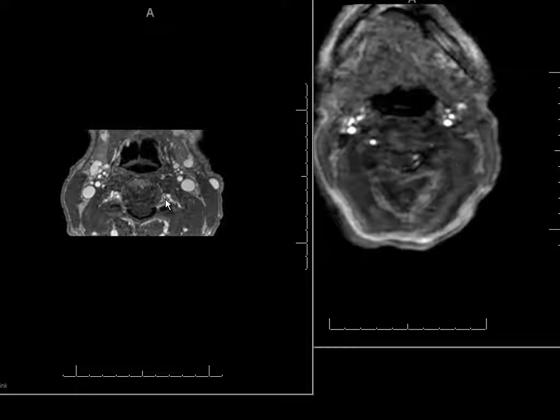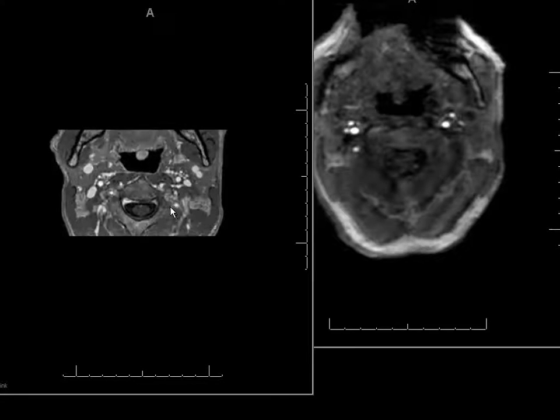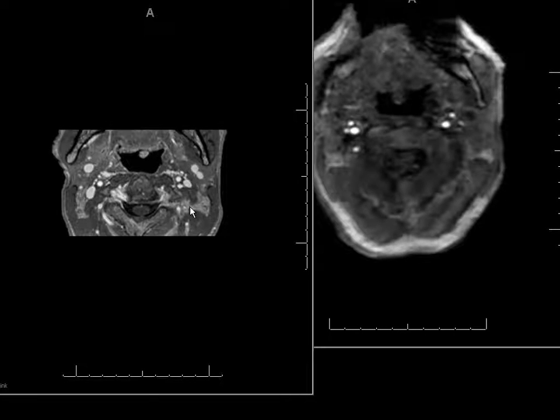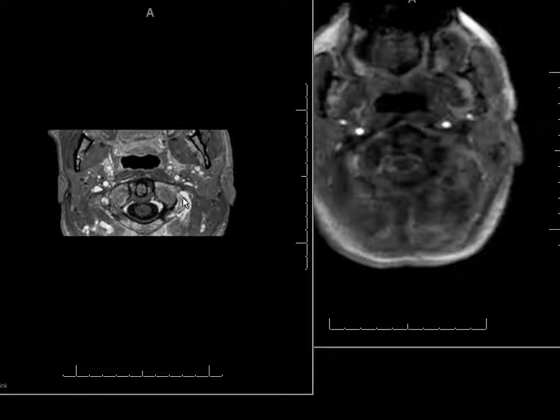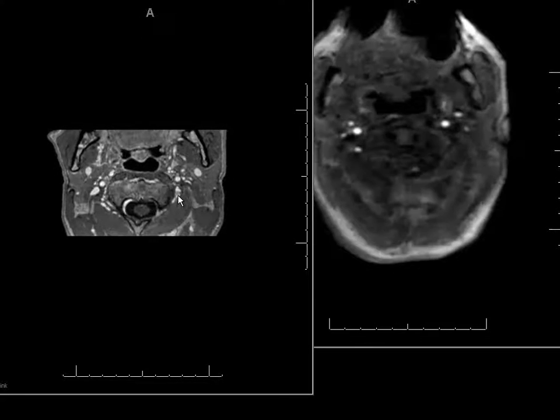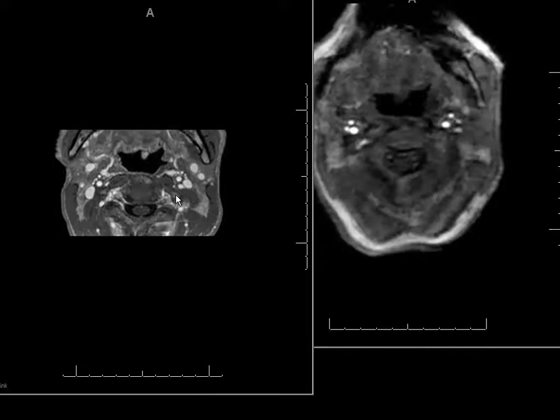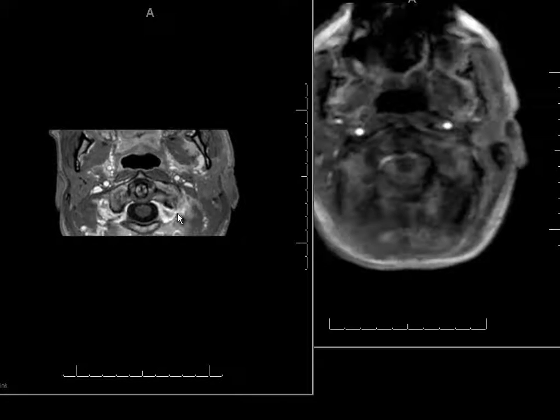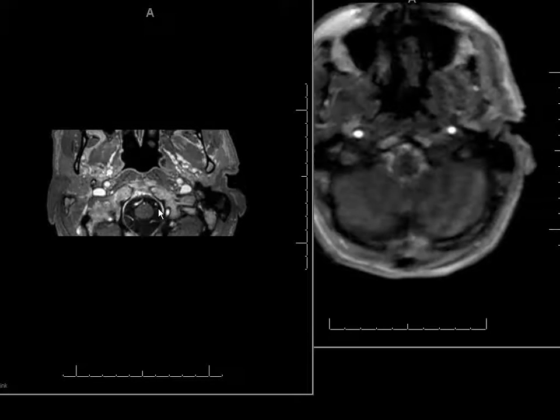So you can follow the left vertebral artery, follow the tip of my mouse. You can follow it, and from that dot, you're going to see this kind of reverse C-shaped vessel. That's the vertebral artery, which is right here. So you can even see it very small, less than 1 millimeter. You can see this vertebral artery has contrast filling it, even in the intracranial portion.